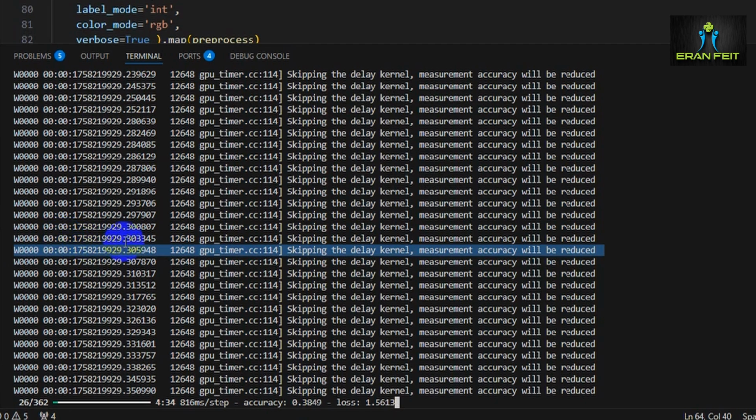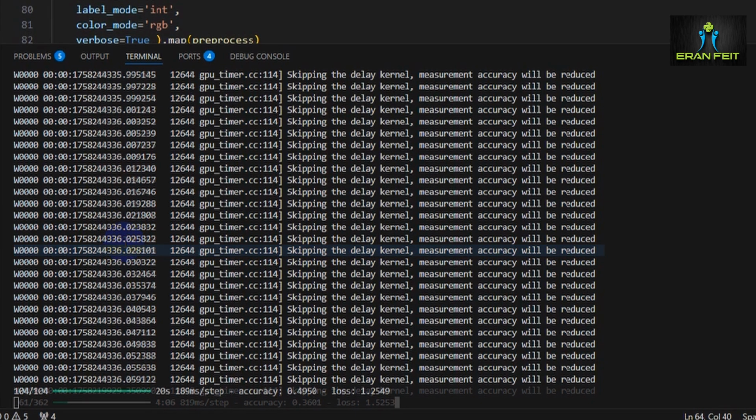And basically I think I will stop the recording now. Of course, we are not going to wait 500 epochs. The early stopping process will terminate it before the last epoch. I don't know yet how many epochs it will take to train on all the images, but let's stop the recording and I will resume it at the end of the training.